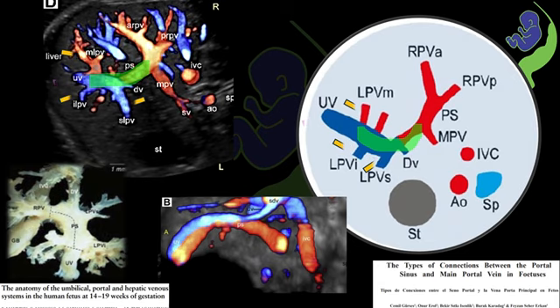The portal sinus, which is highlighted here in green color, is the part of the umbilico-portal system between the inferior branch of the left portal vein and the beginning of the right portal vein. The beginning of the right portal vein is the place where the main portal vein bifurcates into right and left portal veins. It is labeled as MPV in the slide.